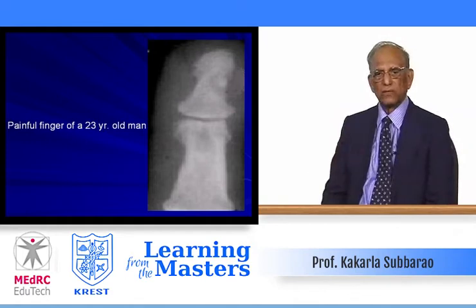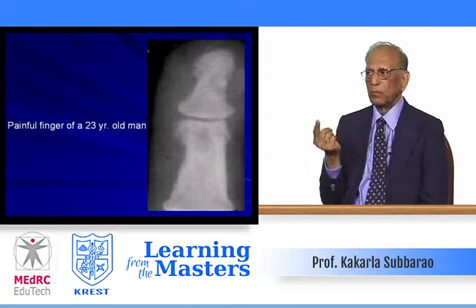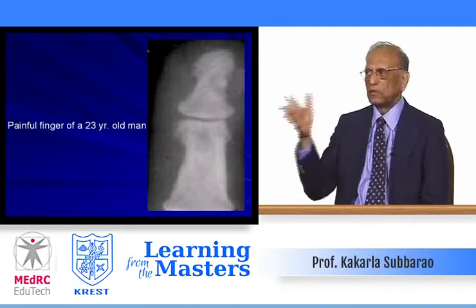I'll give you a few cases for a quiz. Say, take this. 23-year-old man comes with a painful finger. Index finger is painful. Nighttime is worse. What do you see on this radiograph?